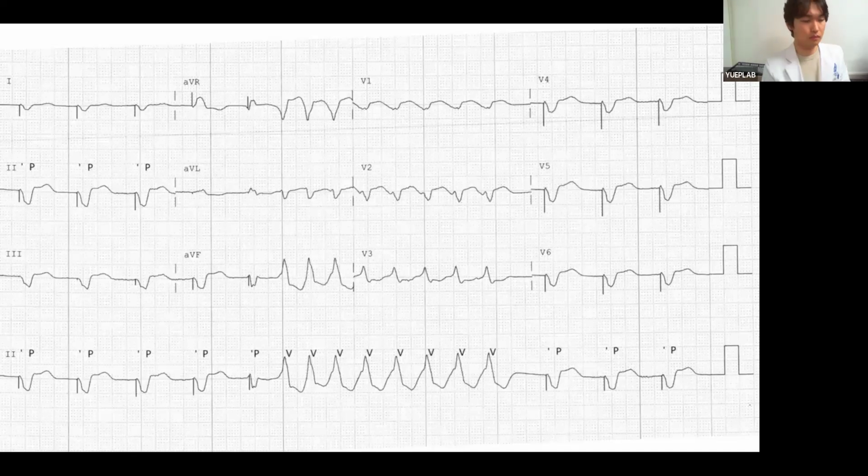In the case of VT, the direction is opposite to the pacing site, which might be a helpful trend. Also, we don't have a 12-lead reader. Okay. So any other comments? Dr. Joe? Professor Kim?